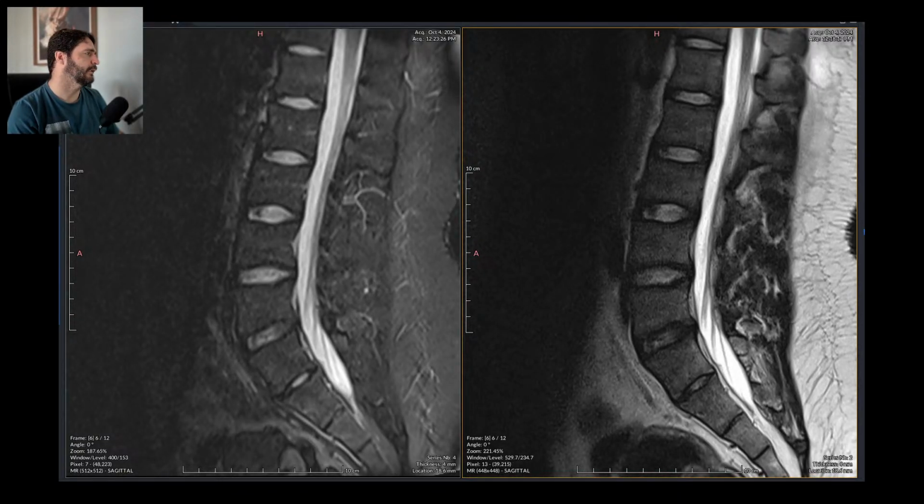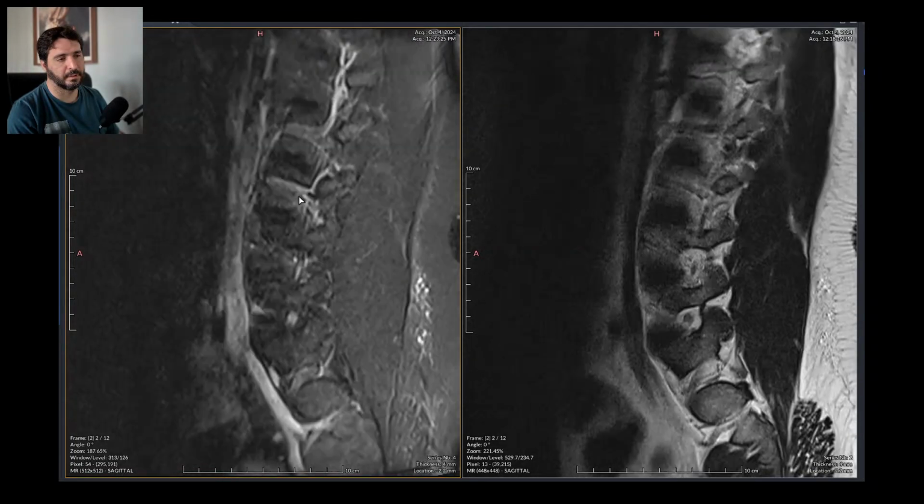So this is a 19-year-old male, and I'm just going to waste a couple of minutes trying to read. It can't be read. It's not properly written down. And there is lumbar pain. Okay. I don't know why I bothered, but you know, I shouldn't.